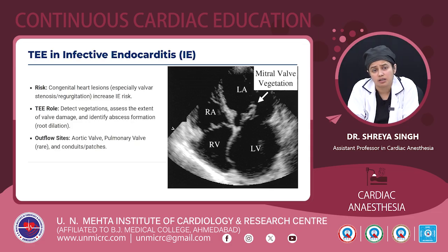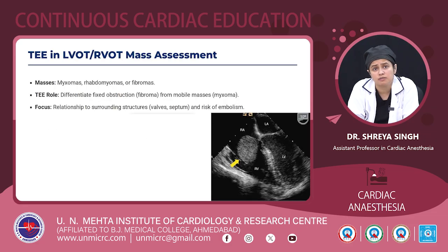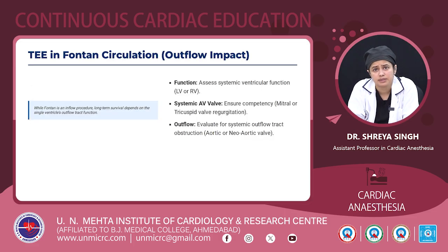So the outflow sites like the aortic valve, pulmonary valve, conduits, and patches can all be visualized for infective endocarditis by TEE. Any mass in the LVOT or RVOT can be assessed, like myxomas, rhabdomyomas, or fibromas. We can differentiate a fixed obstruction from mobile masses, define the relationship to surrounding structures like valves and septum, and assess any risk of embolism by the mass.